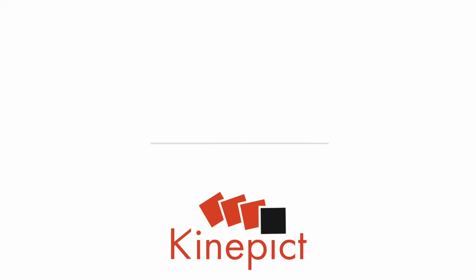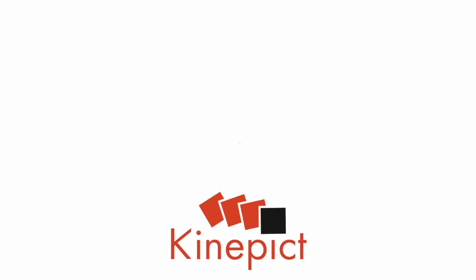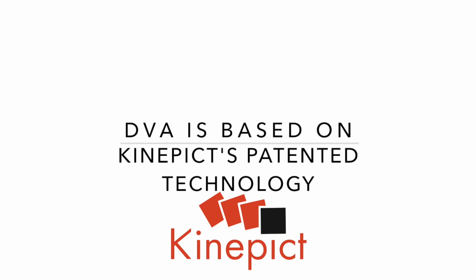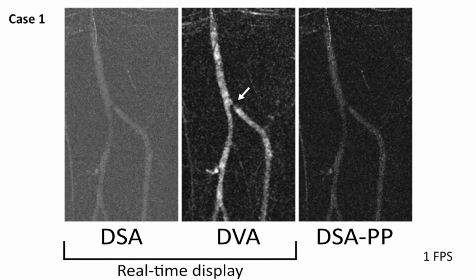Welcome to the next section of our webinar, in which some clinical aspects of the DVA technology will be presented through examples. Part 1, we are going to focus on carbon dioxide angiography. In our first case, the angiograms show a high-grade stenosis at the origin of the anterior tibial artery.